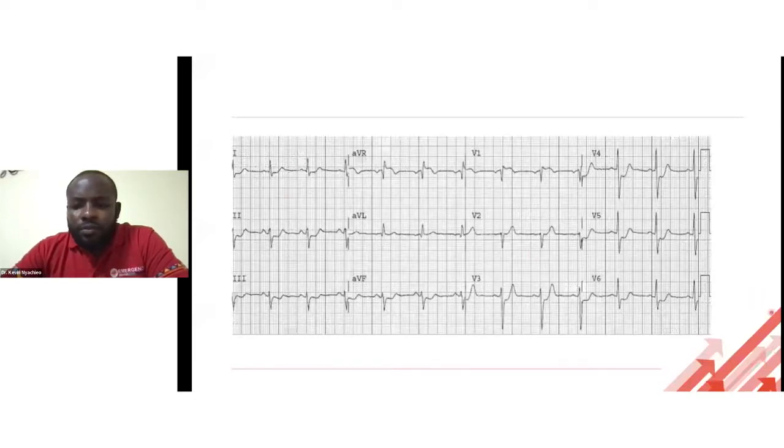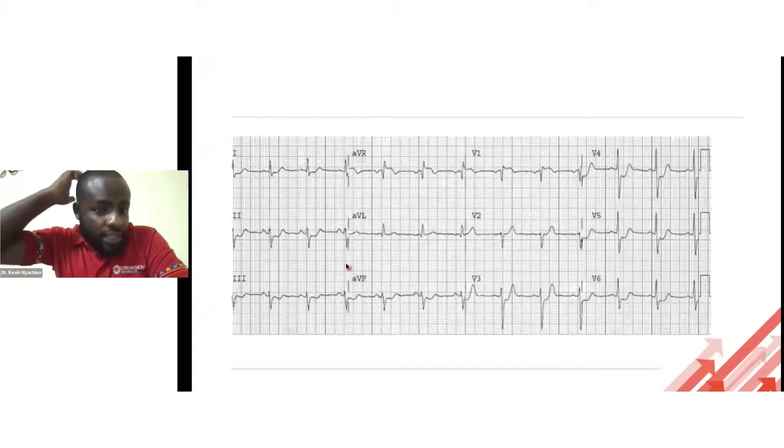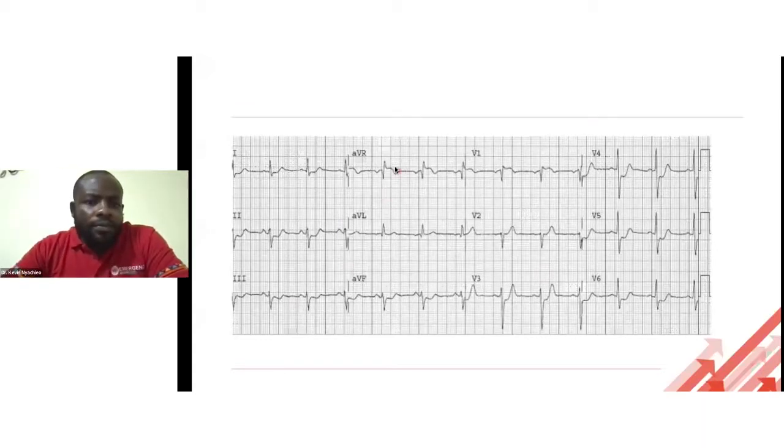So what do you guys think? Is there any ST elevation? Is there any ST depression? Is there a certain lead that usually has ST elevation, ST depression, but now it has an ST elevation? Somebody has got it. aVR, okay. A couple of guys have got it. So you are noticing this ST elevation in aVR, okay.